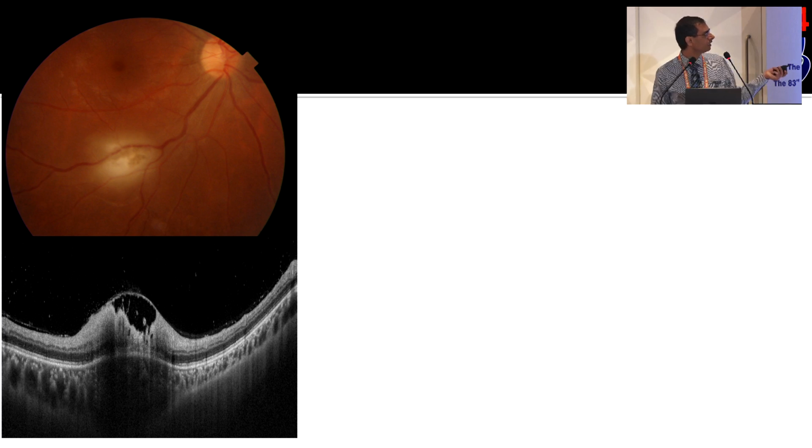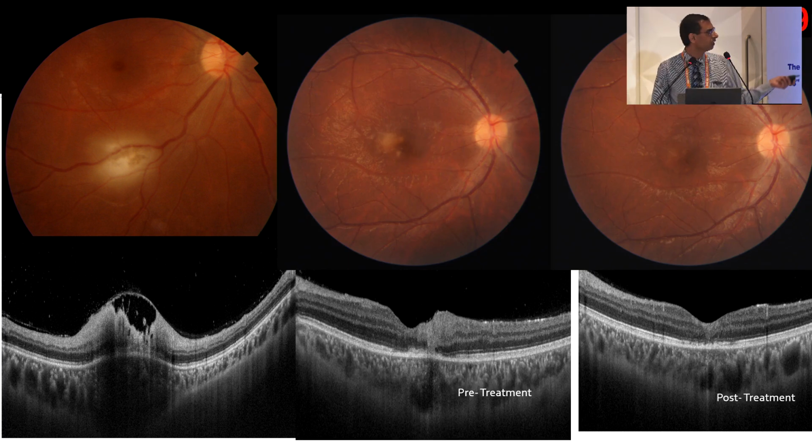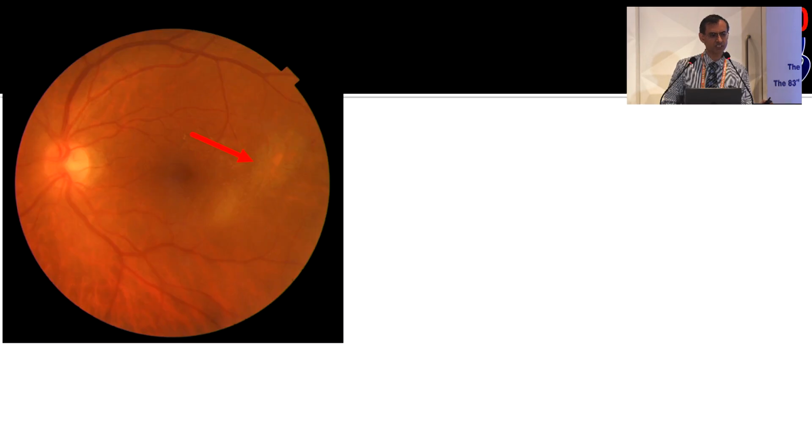So again in this same sort of patient, you start getting this clearing once you start getting more of this necrosis. So only this ILM sort of draping here, full thickness retinitis. And again you see, since it is going to the choroid, this choroid hump has also now started developing over there. Another one, the focal type of lesion without much vitritis, but again because it's initially retinitis, we treated on the basis of toxo itself.